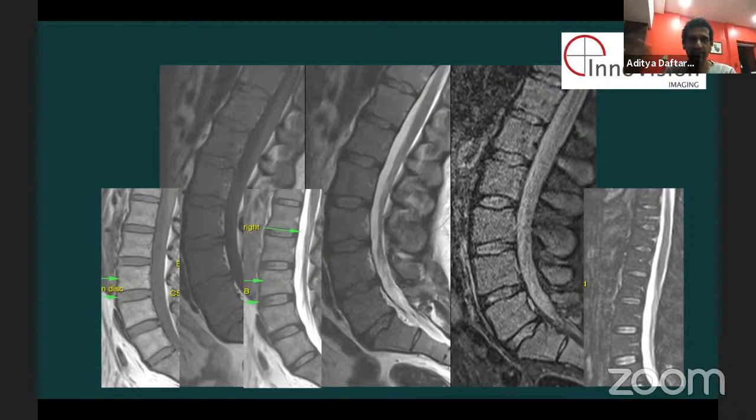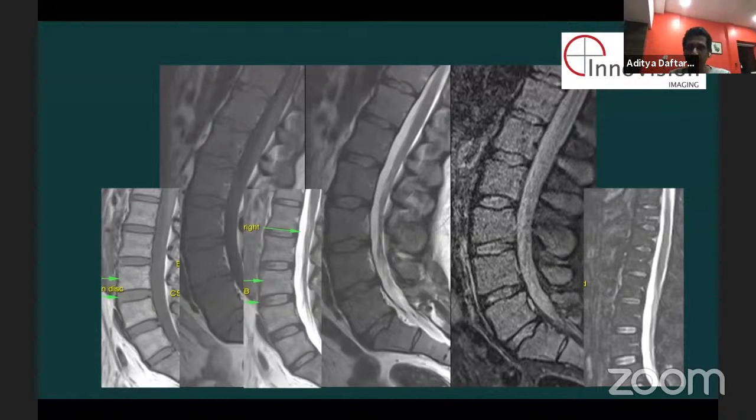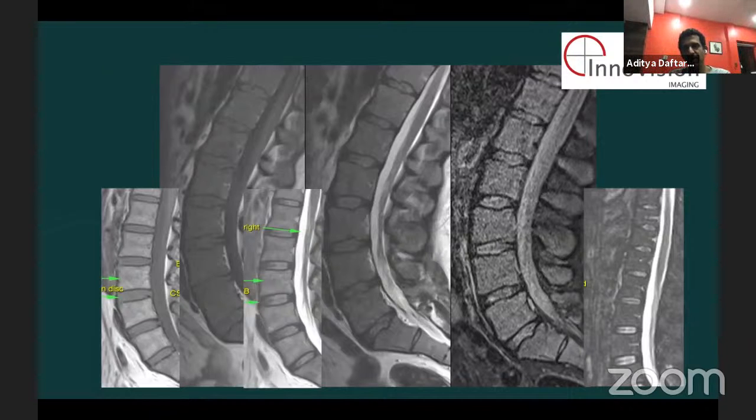And when it is replaced by non-fat cells, you have to think of some diffuse bony disease. Myeloma, multiple myeloma. Multiple myeloma can do this, definitely in an older person. These look like good vertebral bodies, and in an older person you can see this. Anything else? When you say multiple myeloma, you should also think of the standard: metastasis. Exactly, mets. Mets tend to be sort of blotchy, splotchy things sometimes.